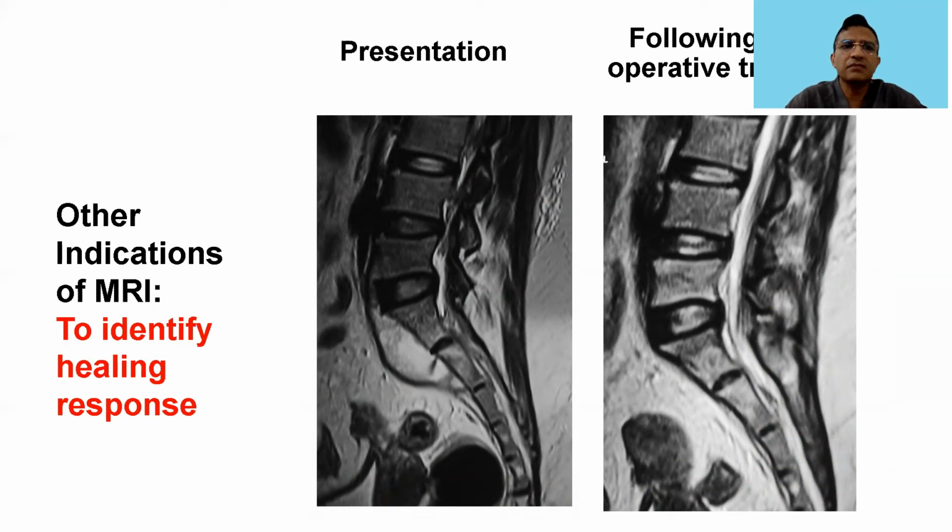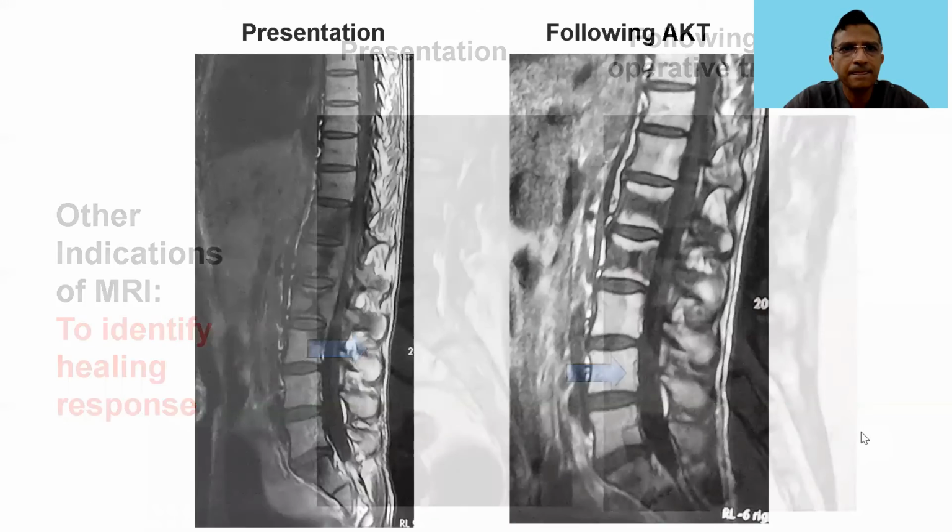The other indication of MRI is to identify the healing response. Now, this is an MRI which was taken before the treatment was started, and one can see the cold abscess there, and there is resolution of the cold abscess following non-operative treatment, as is seen over here.